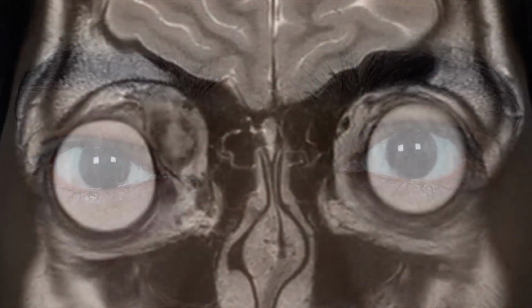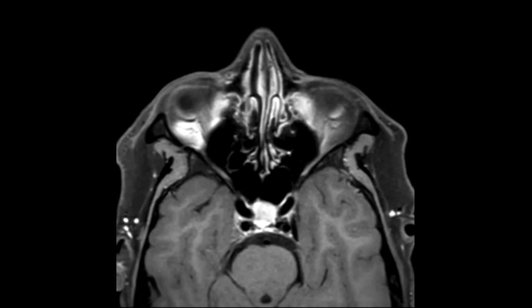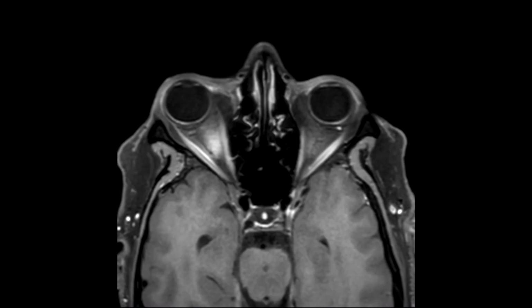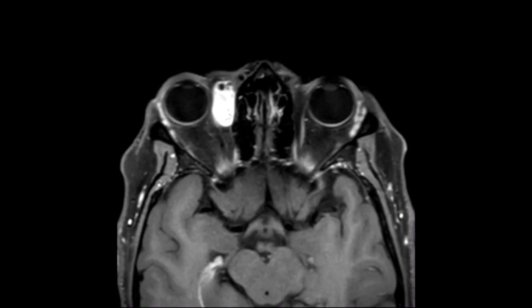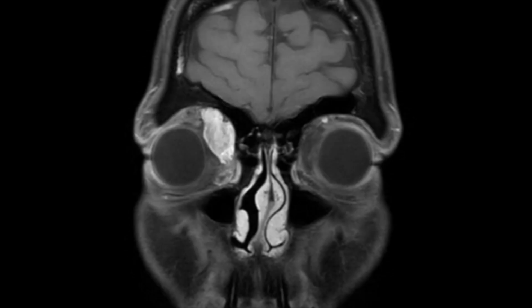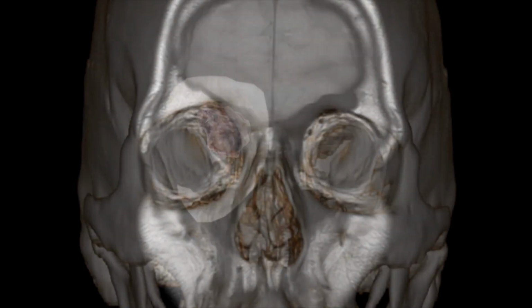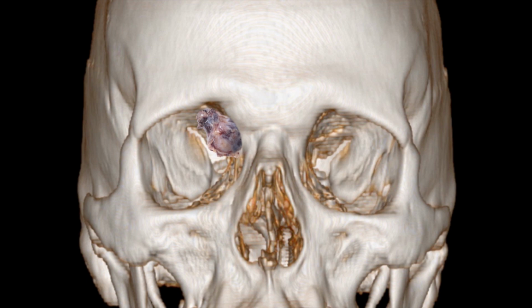Radiologically, he had right-sided proptosis with a well-defined ovoid heterogeneous mass in the extraconal plane along the superomedial aspect, with mass effect on superior rectus, superior oblique and medial rectus, and post-contrast enhancement. With a differential diagnosis of an aggressive nerve sheath tumor or rhabdomyosarcoma, it turned out to be a solitary fibrous tumor treated with surgical excision and EBRT and is now stable.